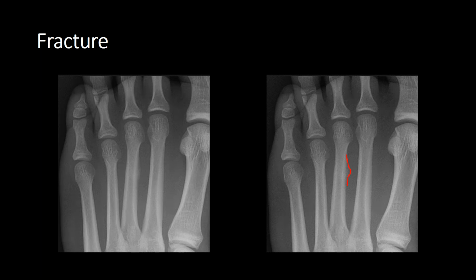This periosteal reaction may take 2 to 3 weeks before it's visualised, so initially patients may present with absolutely normal x-rays. But certainly when you're looking at a foot x-ray, scrutinise the metatarsals very carefully to make sure that you don't miss a subtle underlying stress response.